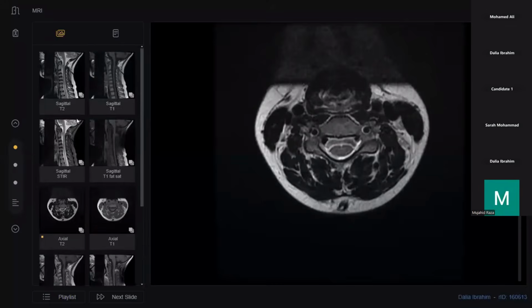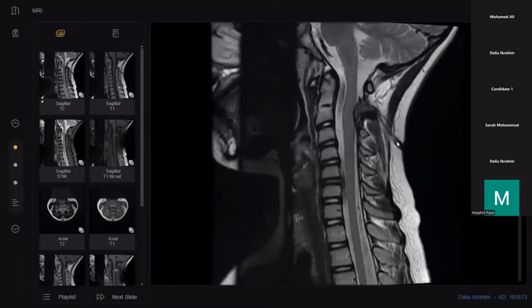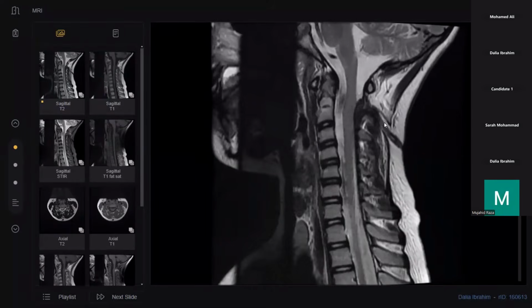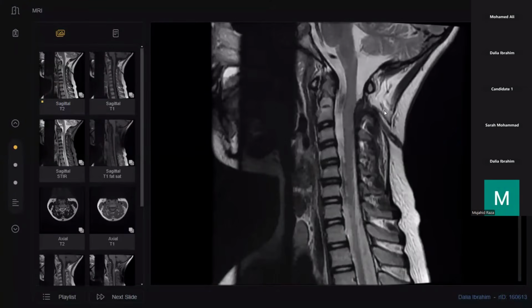Okay. So again, this girl has a history of skin opening, and extending from the skin opening we have a sinus tract which extends in the deep subcutaneous planes and deeply in the interspinous region, reaching to the spinal canal, abutting the spinal cord but not causing any tethering of the spinal cord. Okay, this tract is epithelialized. What does that mean? That I do have epithelial lining with retained secretions and subsequent superadded infection.